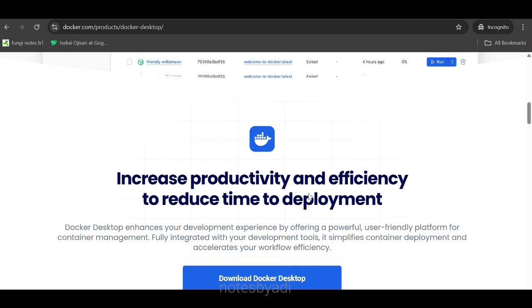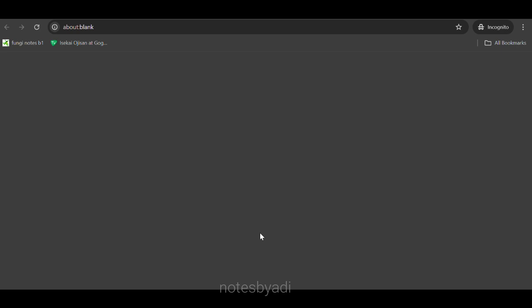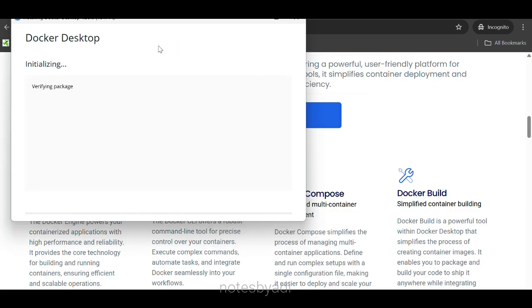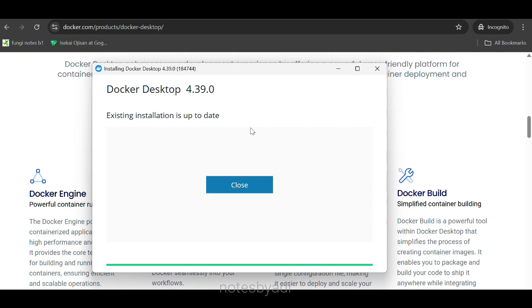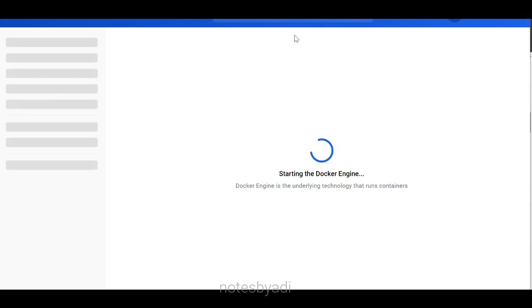We can first head over to the Docker homepage and download the latest Windows release. You can of course adjust this according to your own system. For me, the installation process is already complete, so there is no new update to it. However, you can allow the Docker to extract all its files in a dedicated folder, likely on your C drive.